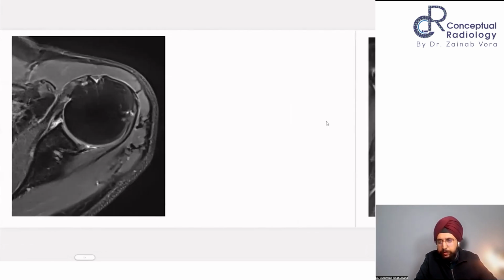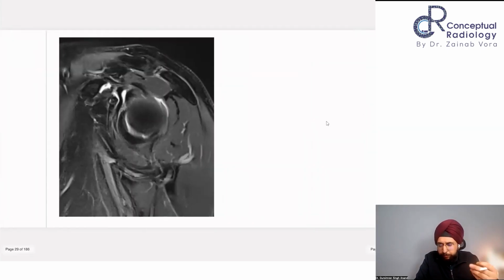It's better visualized on the DICOM images obviously, because by using the DICOM images you can move cranially and caudally to assess the insertions and properly guess whether it is the anterior labrum or it is MGHL. Okay. So obviously we see the posterior labrum here. We do not see any anterior labrum here. So this is a thickened cord-like MGHL. Again, better appreciated on sagittal oblique images. So this is your thickened and cord-like MGHL.